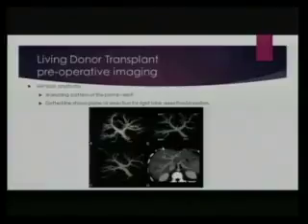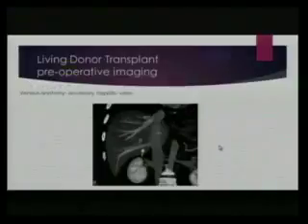In this scenario, you have the right anterior portal vein coming off of the intraparenchymal portion of the left portal vein. Also, again, important to know. So, venous anatomy, you can also have accessory hepatic veins. Here, it's most common in the right lobe and inferiorly, and this is a good example of that. And it's, instead of joining the right hepatic vein up here, it just drains directly into the IVC.